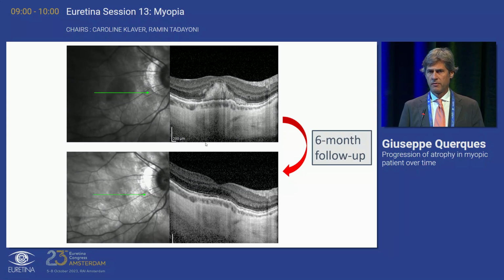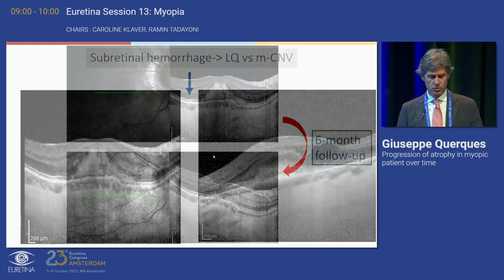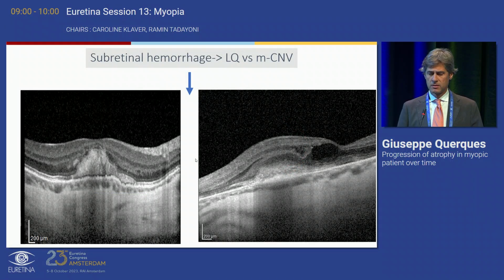This is in our study. It was then further demonstrated by following up these patients without treatment, with complete resolution. These are side-by-side cases of simple bleeding and bleeding related to neovascularization. You can see that there's no hyporeflective line here.